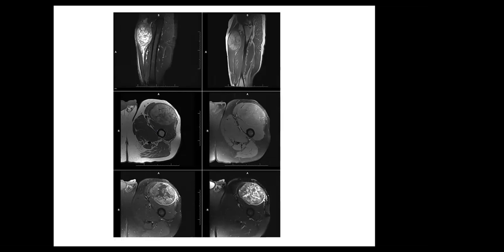You said the tumor is in the anterior compartment, and again in the thigh we don't really use the term anterior compartment. What compartment is this? A lateral compartment. There is no lateral compartment in the thigh. So there is a hamstring compartment. Yes.